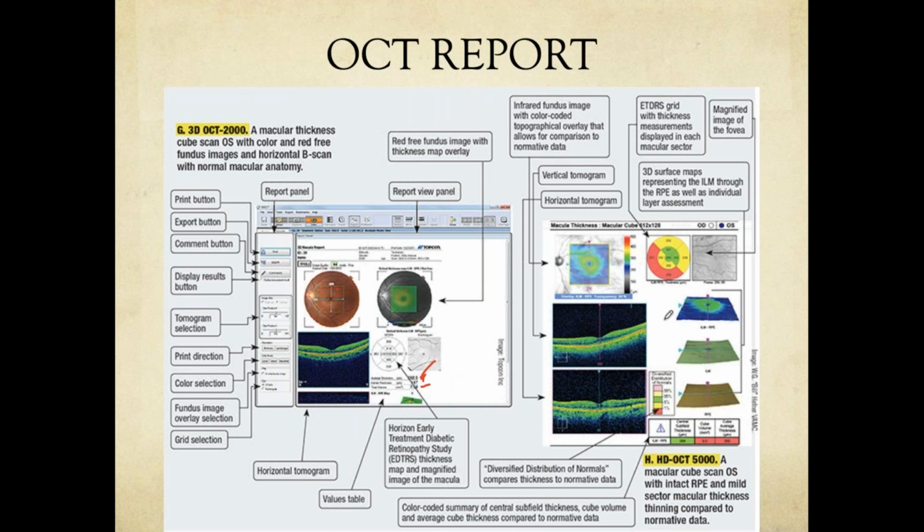Fine. So moving forward, this is the macular thickness cube, where again the images are done in blue, black, white, red, or black. So what you just need to do is compare the macular scan with the thickness. So just by looking at it, I see that most of the macular area is in the green and the yellow zone, which is the normal over here. So I would suspect it to be somewhere around 320 or something like that, right?